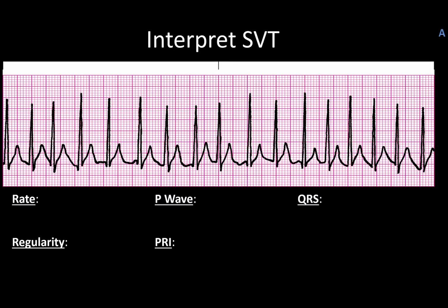Okay, just a couple more SVT rhythms for the accelerated arrhythmias class, just to give you a little bit more practice, because these can be tricky. We'll go ahead and get this marked out. Of course, it's a 6-second strip, as always.